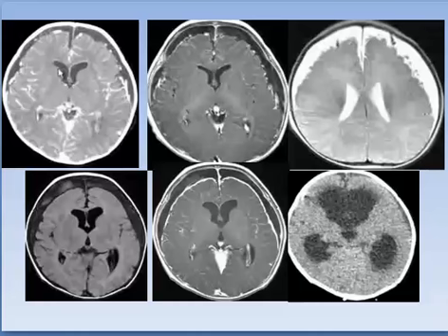Now here we have bilateral subdural empyema as seen in T1 weighted images with contrast, enhancing margins, and this is the start, enhancing meninges, and these are showing similar changes. Of course, this group is different from that group, and see here the empyema on both sides.